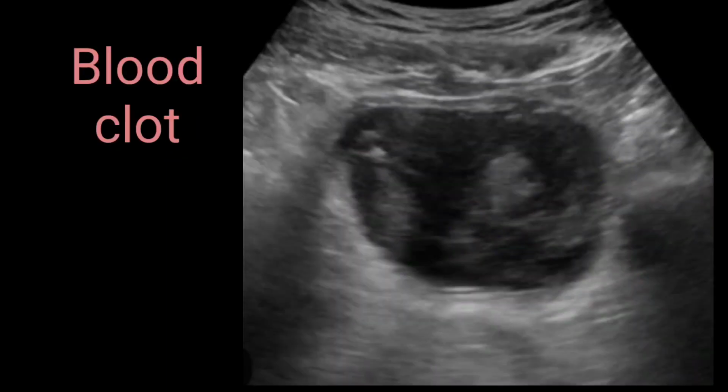This is another pattern of blood clot. Here you can see this is the urinary bladder, and within it there is a fibrinous collection, a blood clot, but the echogenicity is slightly lower compared to the previous slide. Again, I would say it depends upon the age of the blood clot. If it is acute, it will appear slightly hypoechoic like this. This is the acute blood clot. And if it is chronic, then it will look slightly bright or echogenic. So do not confuse between that.